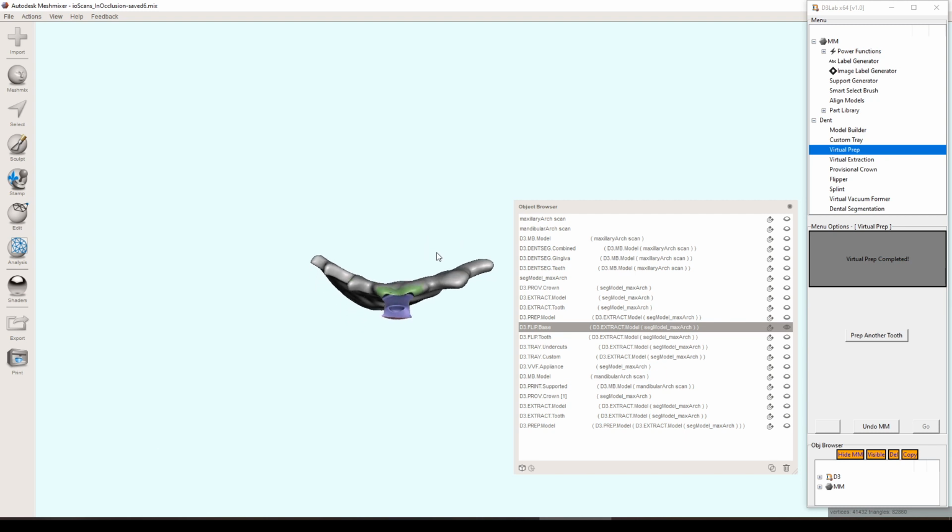And again, this is a tool just to generate something that you can then take and manipulate after it's printed. You're going to have to do a little bit of finishing, a little bit of grinding, polishing, those types of things. So this is just to get you started to the final product. This is a really, really good starting point.